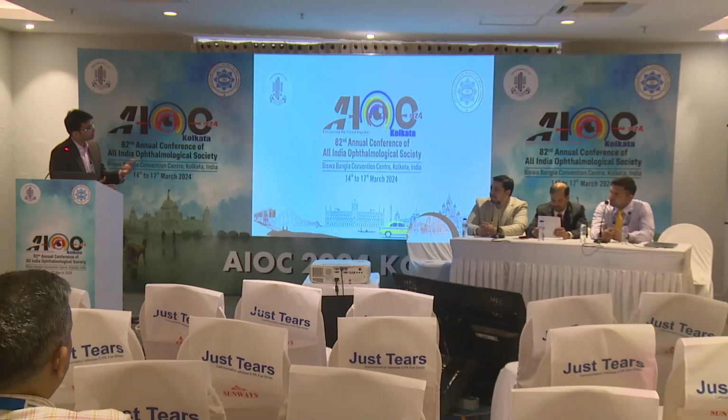And the Spectralis by Heidelberg, sometimes I feel that provides better slab information rather than the swept source imaging.